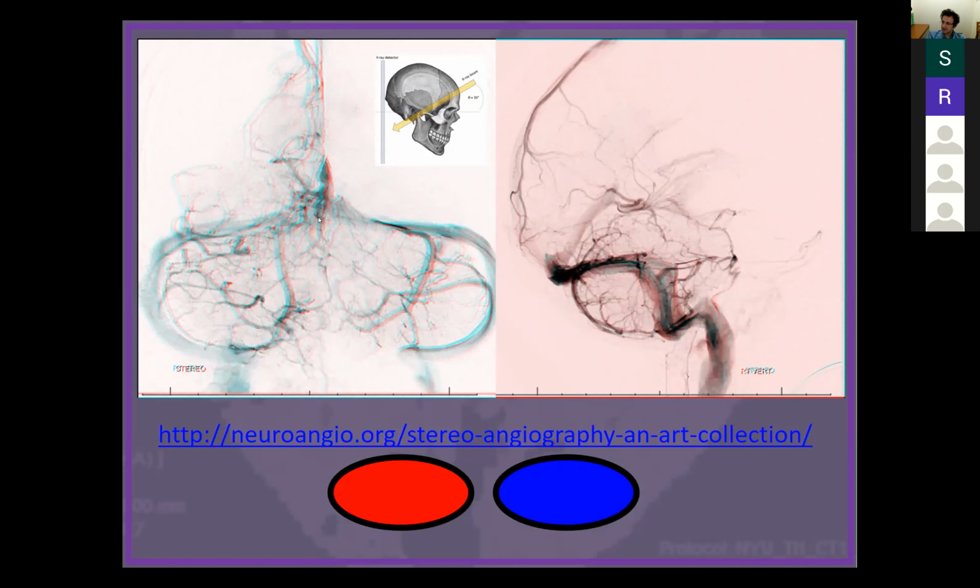This is the precentral vein, this thing here. Trust me on that. That's the precentral vein, and it splits into these two. You see how there are two of them here? And that splits into these two veins that run along the superior cerebellar peduncle. These veins coming up from below over here and over here are the veins of the lateral recess of the fourth ventricle.